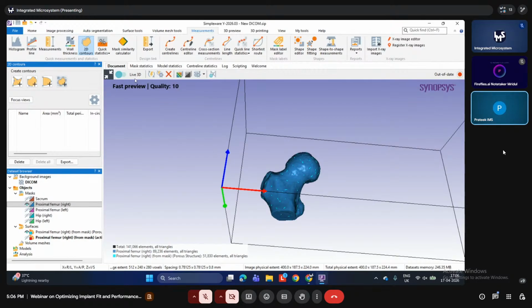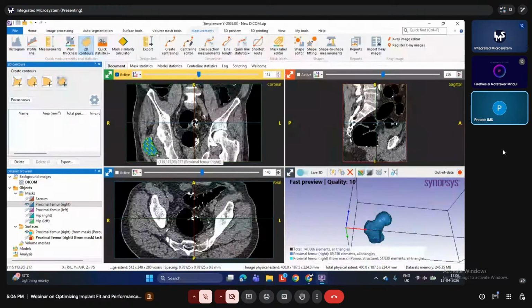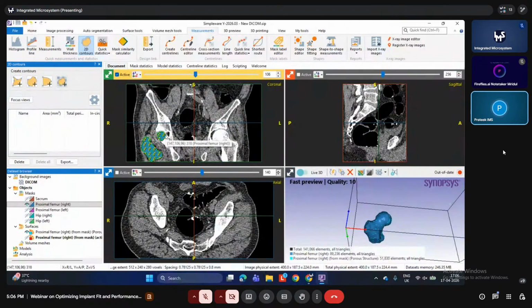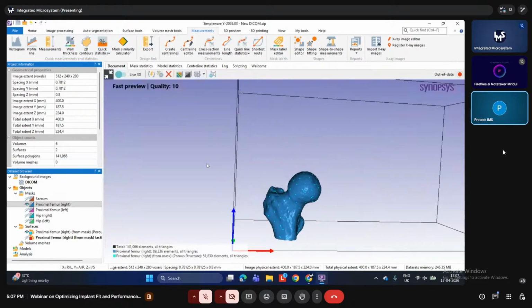So for example, if I want to work on the 2D set, here I want to see the distance between these and this, so I can directly create the contours out of it, and I can see a variety of measurements from here. So for creating the contours, you can use any contours available and directly work like this. Moving forward to the quick statistic analysis, let's open it.